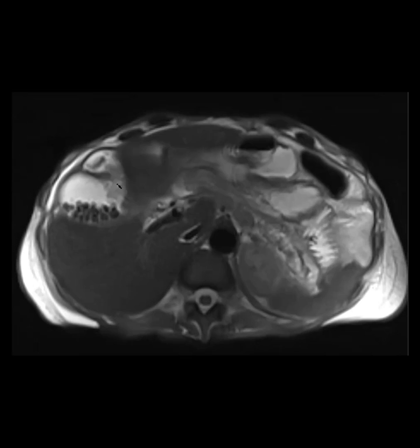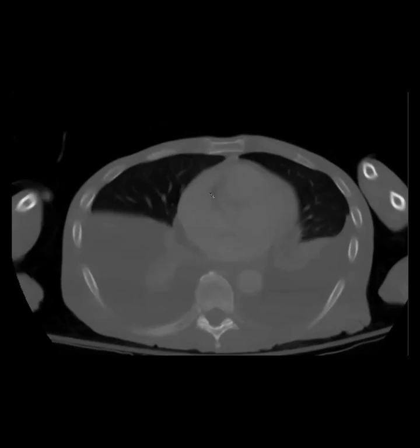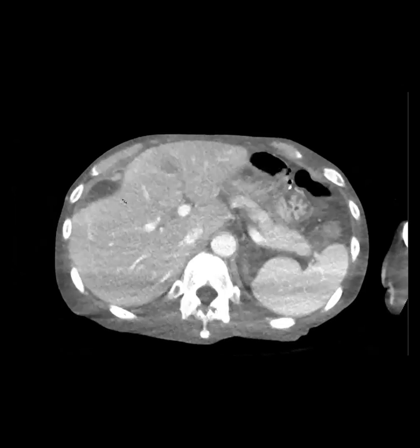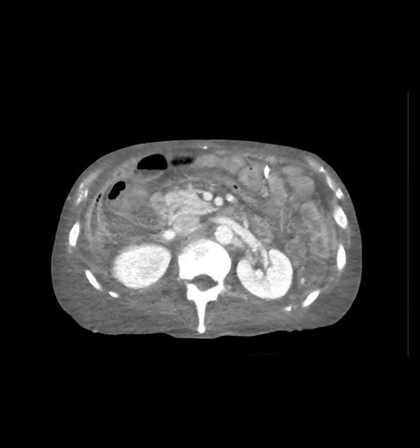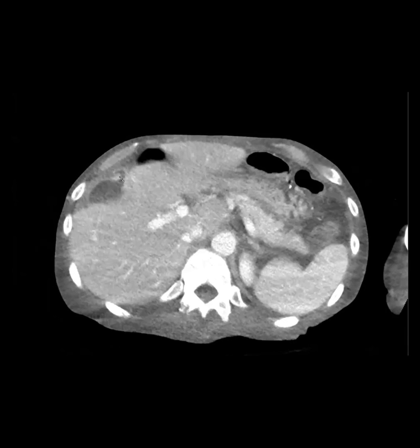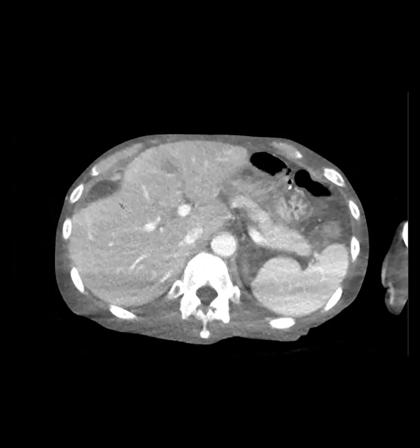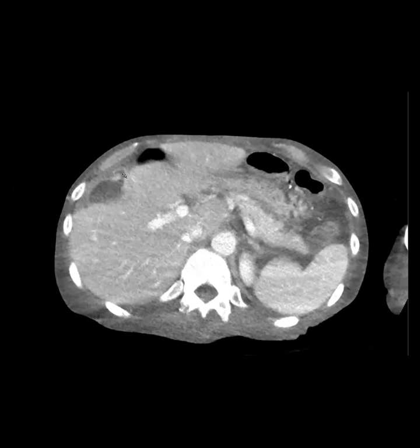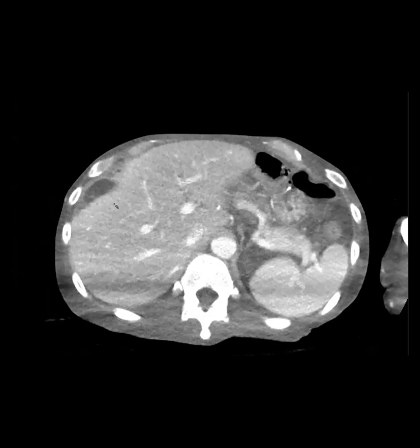Yeah, interesting. Okay, well, he's not a surgical candidate, and they put drains in, and I wanted to show the post drain. So actually, this is now the decompressed gallbladder with the stones in it. Yeah, there's some enhancement. There's the rupture there. There's some abnormal enhancement to that wall, though, if you go back up to there. Just anecdotally, my two cases have been underlying cancer.